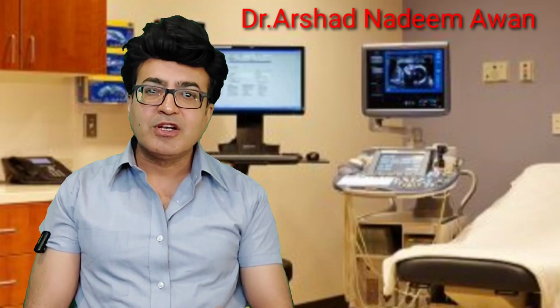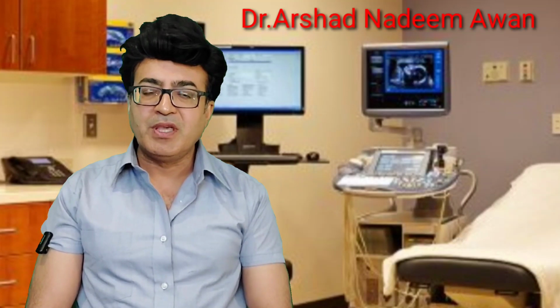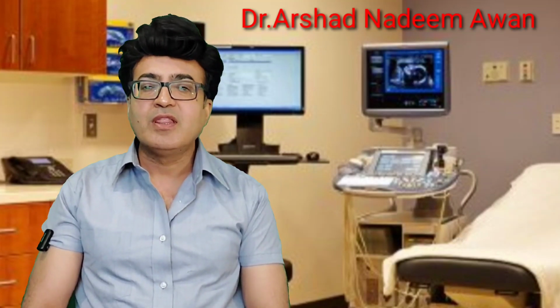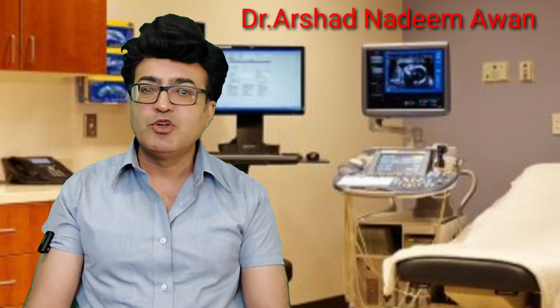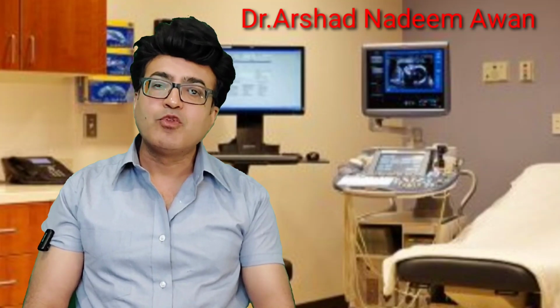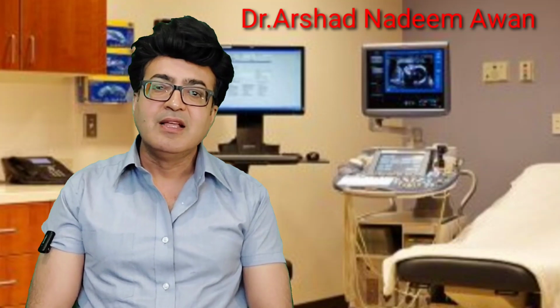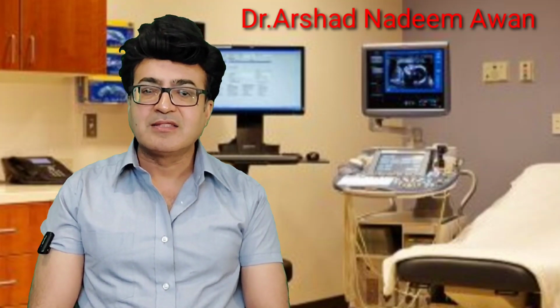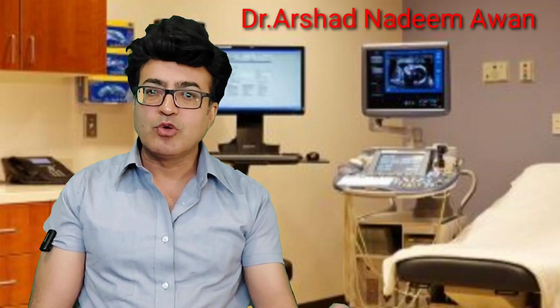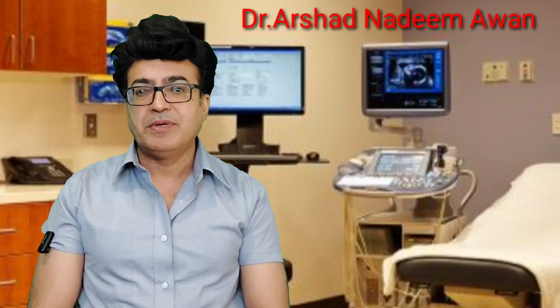There are certain important signs which indicate that this would be PID. The first is called the cogwheel sign. When the fallopian tube gets thickened, and the internal folds get thickened up to 5 millimeters, that would be called the cogwheel sign. The second sign is called beads on a string. It will appear as beading, so you will see on the images later. The third sign is incomplete septa.